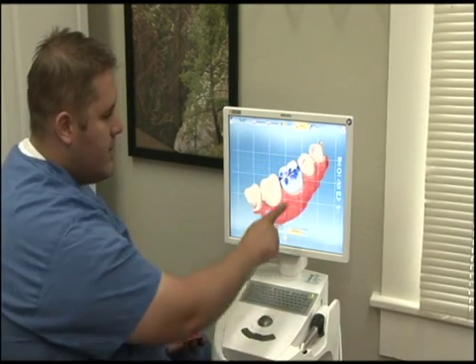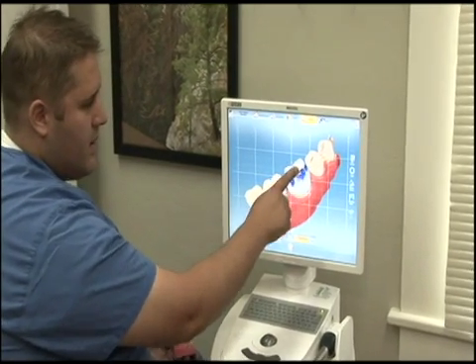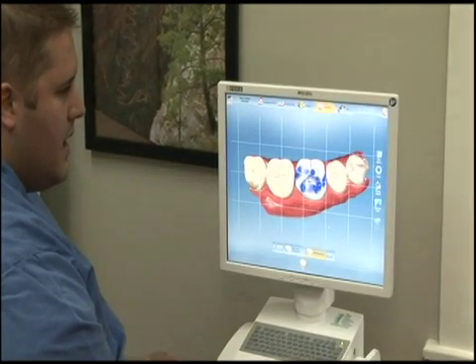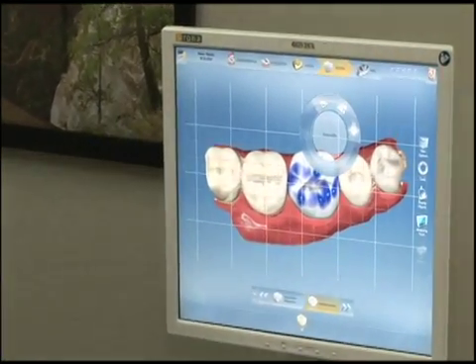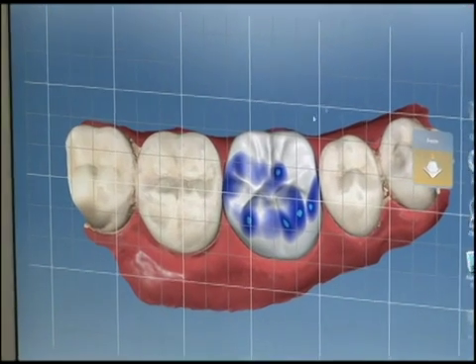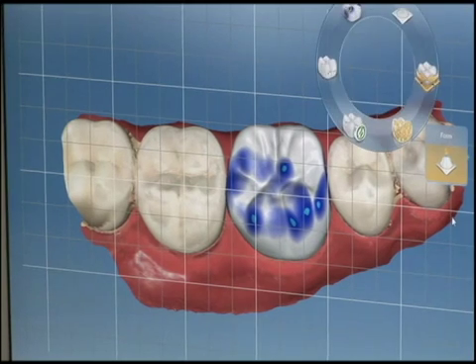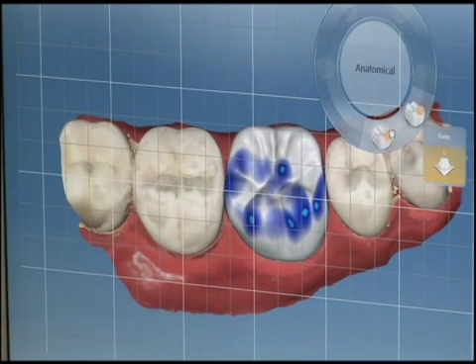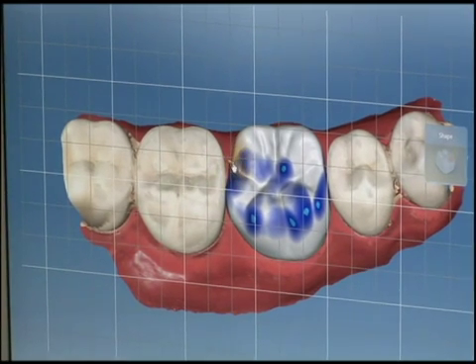So you can see there's the computer's proposal for the tooth, and it's proposed that you bite on the tooth at those points with that much strength. And now I have the opportunity to go in and decide if there's anything I do or don't like about the crown. I can change it. So for example, if I'm worried that the crown is too narrow right there and that you're going to get food stuck, then I can widen the crown as much or as little as I want to prevent you from having a food trap right there.